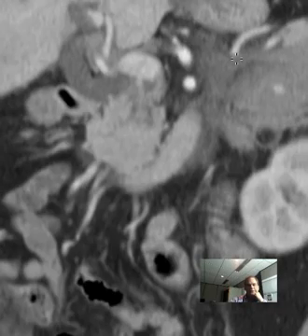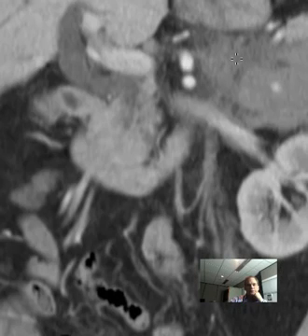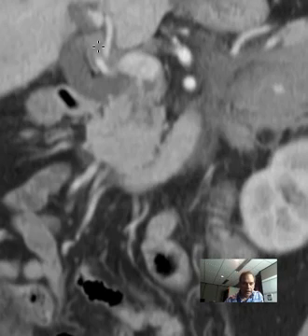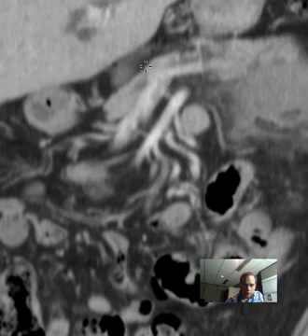And let's see, if this is the portal vein, which I'm going to suggest, it's going into the liver, it should be collecting venous drainage from the mesentery, from the bowel. And if we go forward, here it is here, here it is here, and here it is. This is a perfect shot to illustrate the superior mesenteric vein and the superior mesenteric artery.